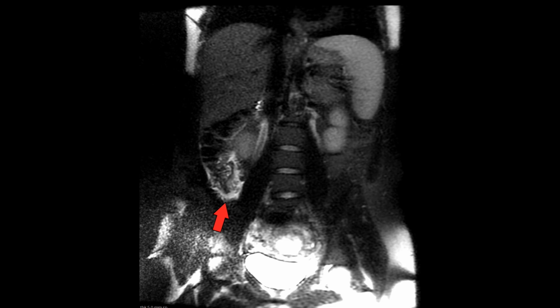The main difference is how the surrounding inflammation appears on MRI. Without getting into too much detail on all the various MRI sequences, which can be a very complicated topic in itself, inflammation on MRI will be bright on sequences where fluid is bright, such as T2, as seen in this MRI image of a patient with acute appendicitis.